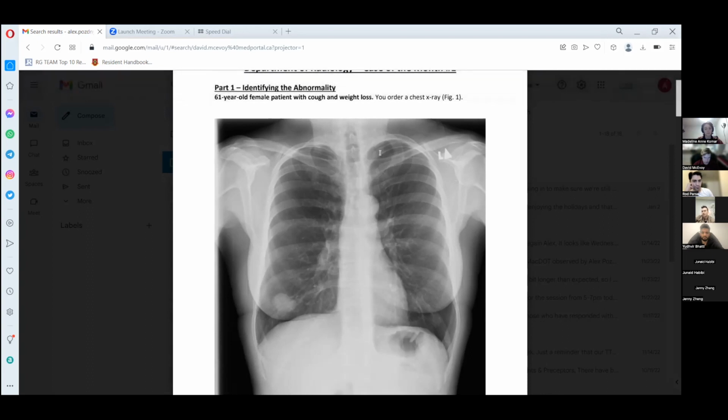And also we have the soft tissues. Soft tissues are also sometimes going to be creating visual illusions for you. Soft tissues are notorious for creating faint lines that will trick you into thinking that there might be a pneumothorax or some other lung abnormality, but you have to be very mindful of the overlying soft tissues.